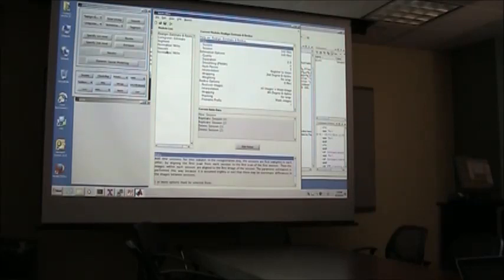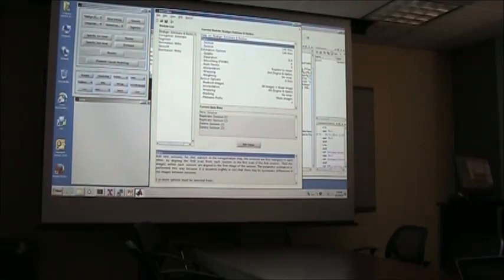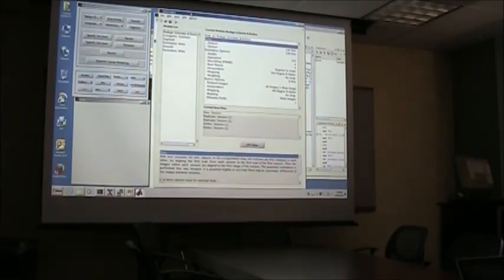Instead of doing it one by one, at least for one subject, you make one big set of processes that you do. Save this file, and then you can use that file as a template for other subjects. So these are two ways you can make sure your analyses run a lot faster.